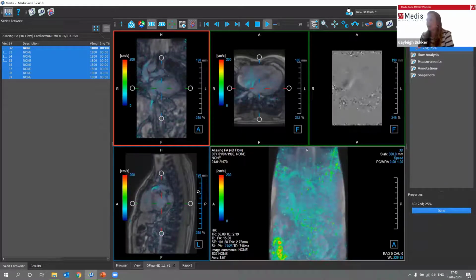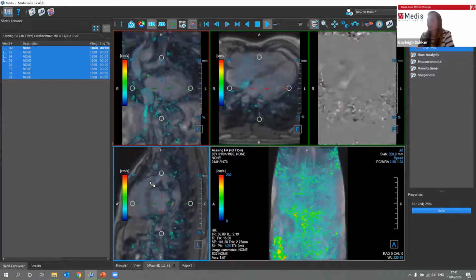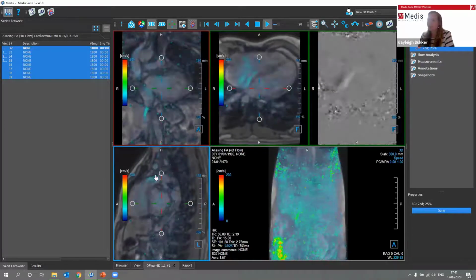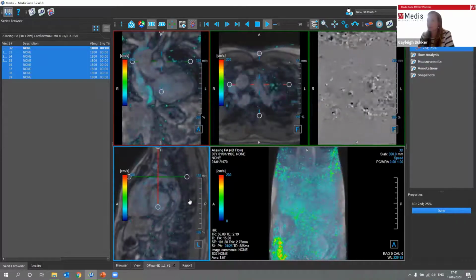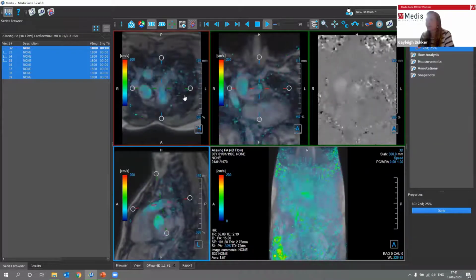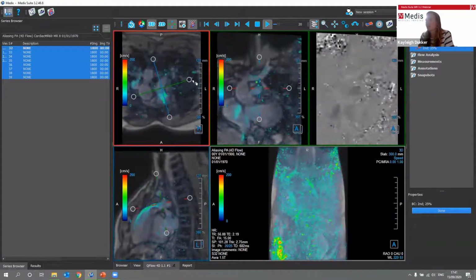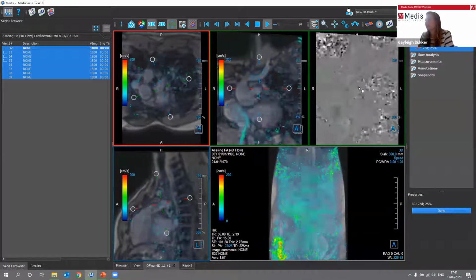And here you can see a bit less obvious, but still present, also some aliasing artifacts. You see them a bit smaller and more differentiated. So not one spot, but multiple spots. So a bit harder for me to get it to the right plane so we can see it in here. But I think, got it. So here you can see now the black spots in white.